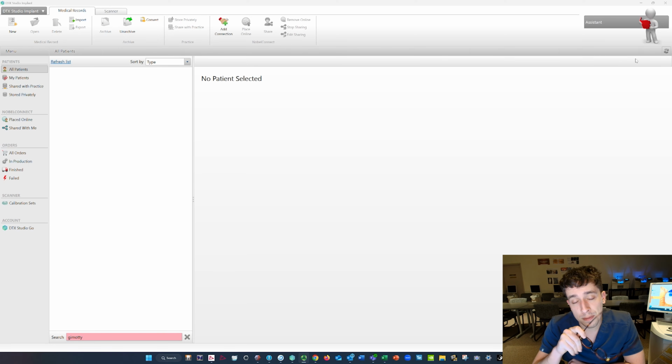So today we're going to be going through DTX Studio, which is Nobel Biocare's implant planning software. We're going to be aligning an edentulous case. So this is going to be for a patient. We're doing an implant overdenture on the mandibular.